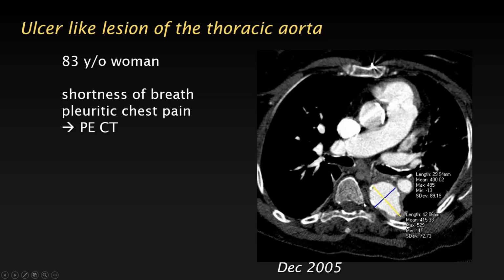Now, where's our non-contrast scan? Well, unfortunately, we don't have it because it was a PE study. And as you know, for PE studies, we don't routinely do non-contrast scans, so we can't help ourselves with that. If we needed a non-contrast scan, we would have to wait maybe 5 hours or so, until all the contrast is washed out, assuming the patient has normal renal function, then repeat the scan. But the other option is, in this case, we were lucky that we were digging in the PACS and we found some old images of this patient.